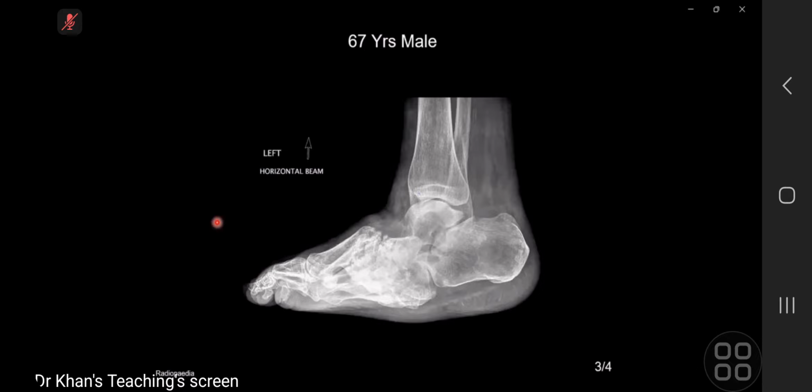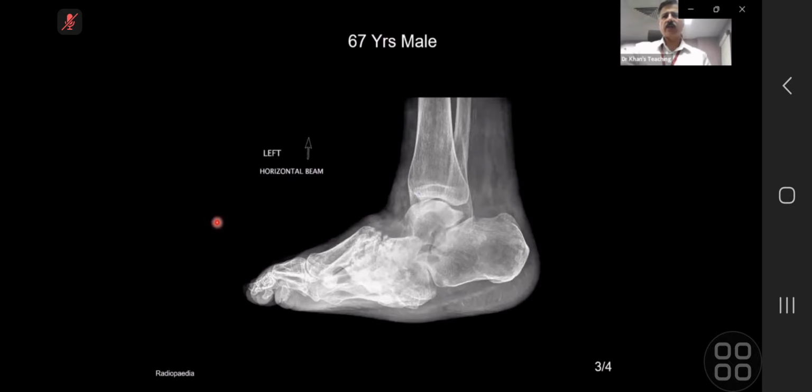Excellent. So this is Charcot joint, classical. We will cover it in our 4th chapter. But here what happens is that this is a diabetic foot where there is bony destruction. Look at the density, which is increased. And the inference is that because the navicular is destroyed, there is a dislocation there. And you can see that rocker bottom effect.